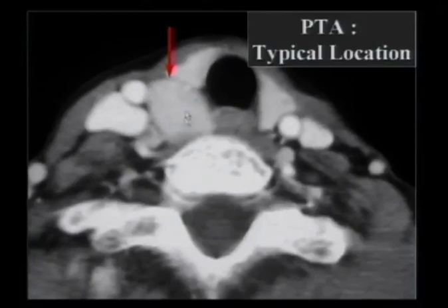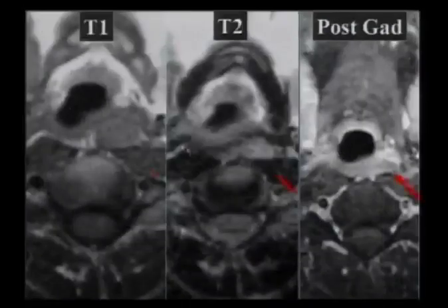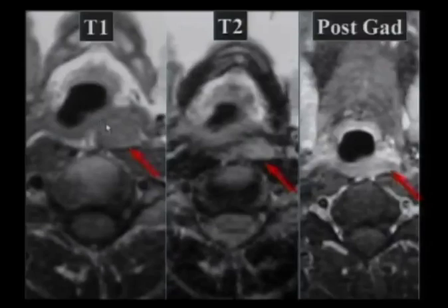So this is a typical normal location of a parathyroid adenoma, right behind the thyroid gland, just medial to the carotid artery and jugular vein. Here's a retropharyngeal parathyroid adenoma. They're usually isointense to decreased signal intensity on MR, usually showing low to intermediate T1 and increased T2 signal, often even brighter than this one. And they're very vascular lesions. So on MR and CT, they enhance like crazy. And you can see this one enhancing pretty well in the retropharyngeal space.